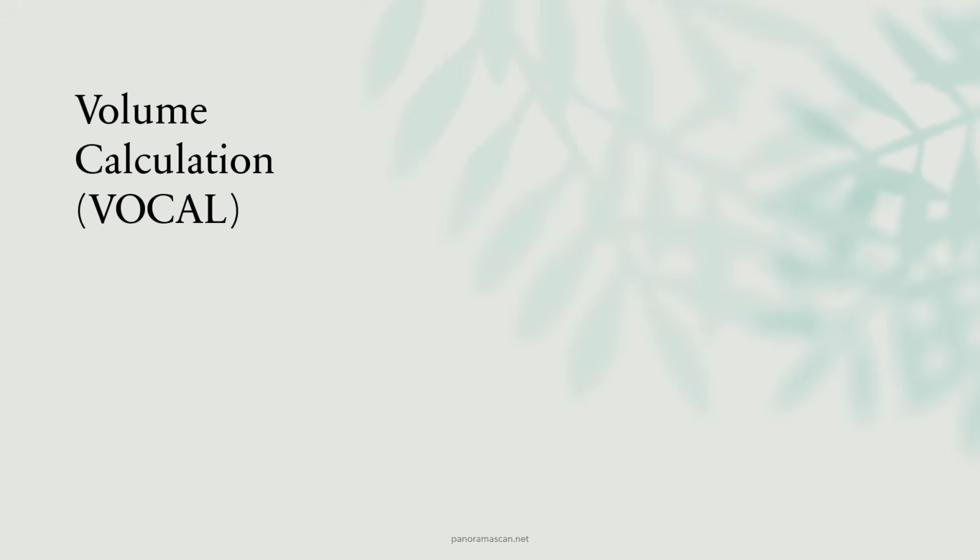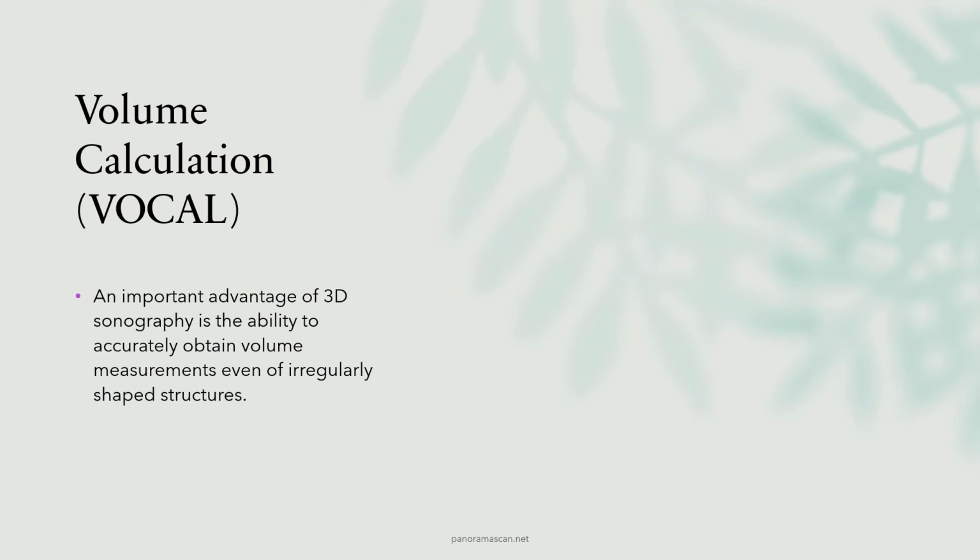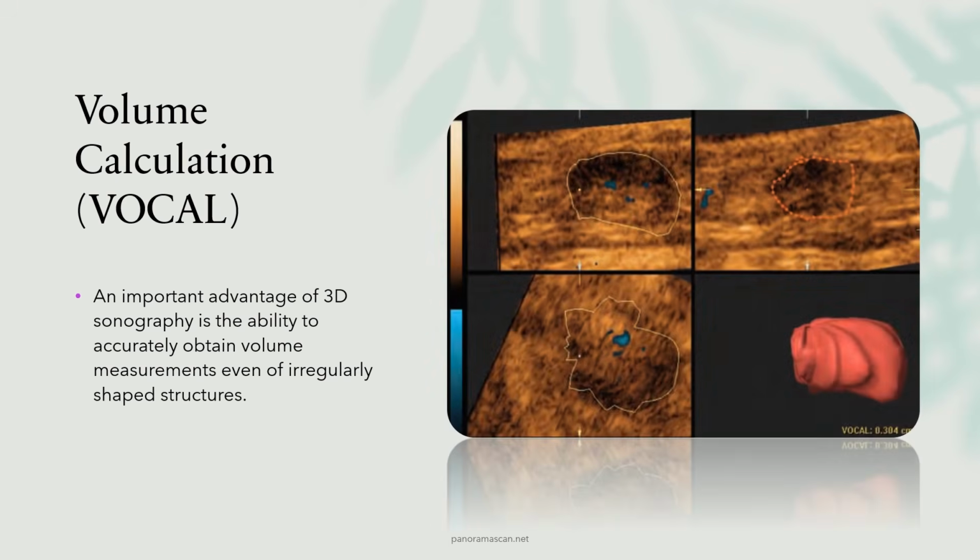The ability of 3D sonography to obtain accurate volume measurements of irregular structures provides clinicians with an enhanced tool for diagnosis and monitoring. From fetal organs to pathological growths, the precision offered by 3D ultrasound allows for early intervention and more informed treatment plans, making it an invaluable technology in fetal medicine.